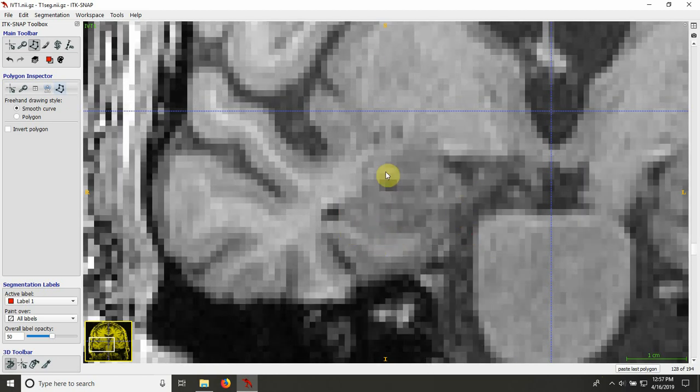Okay, so one slice anterior, and again, if I'm following the amygdala, I see some darker voxels here and here. So I think this would be the outline of the amygdala, so that means that that was probably the border with the hippocampus. So the border with the white matter, and then I see some darker voxels here, the border with the CSF. And I'm including this portion. Again, I think probably this is a vessel, this is not hippocampus. Going to more or less the most medial point, and then the border with this white matter.